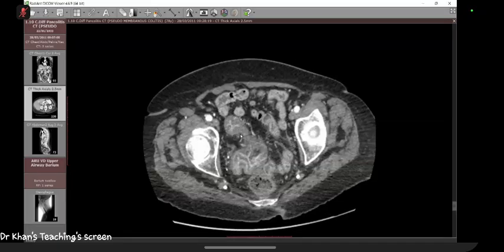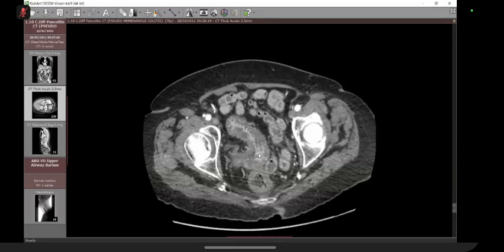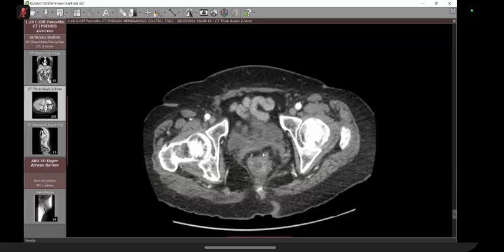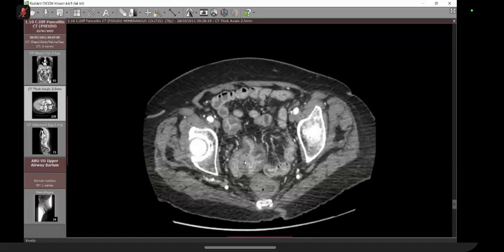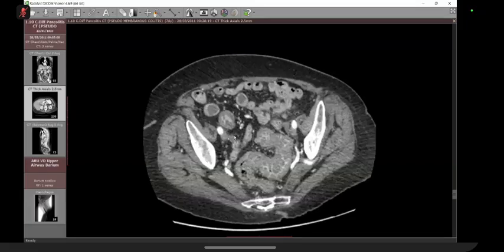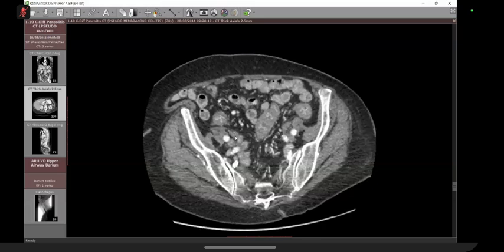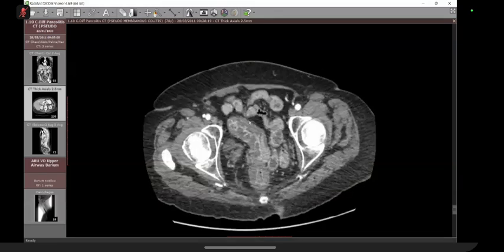And do you see this cecum is sitting in the pelvis? So it is so redundant. Having said that, what do you think is happening? Now, interestingly, this is the cecum and this is maybe the ileocecal junction. So this is a very abnormal cecum, but that is embryology. So is it a case of pancolitis? What is your differential?